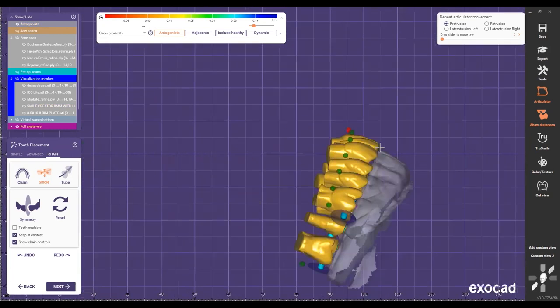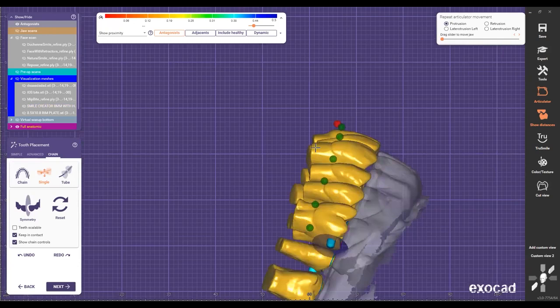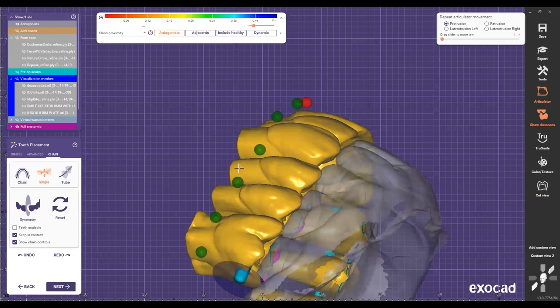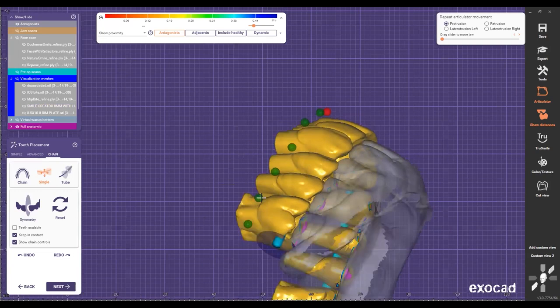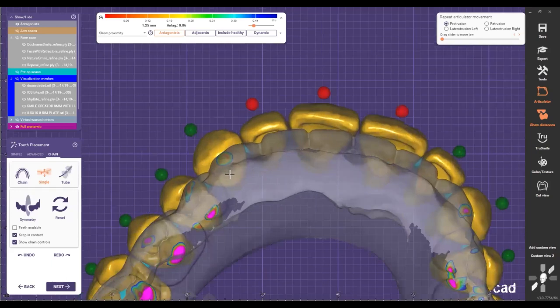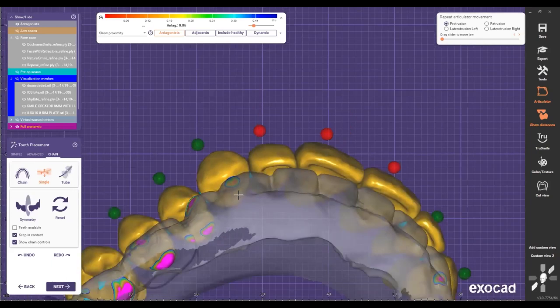And then I'm just gonna move everything here. And I'm like, okay, I feel happy with that. Now I lock it. Now let's go to the next one. And then I'm gonna go on this one and I'm just gonna bring it out a little bit, just like this, and then bring it in and like that. So to give that contact.